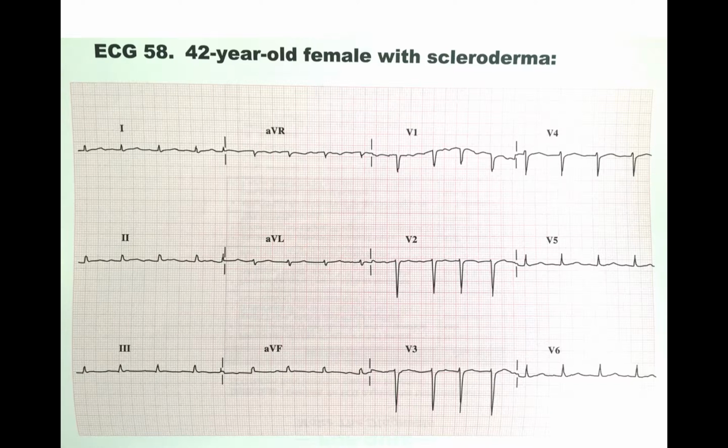And if this progresses, it can ultimately lead to cardiac tamponade, which results in a hemodynamically unstable patient. And once you get to that point, you almost always have sinus tachycardia. In this case, like I mentioned, we have some borderline tachycardia.